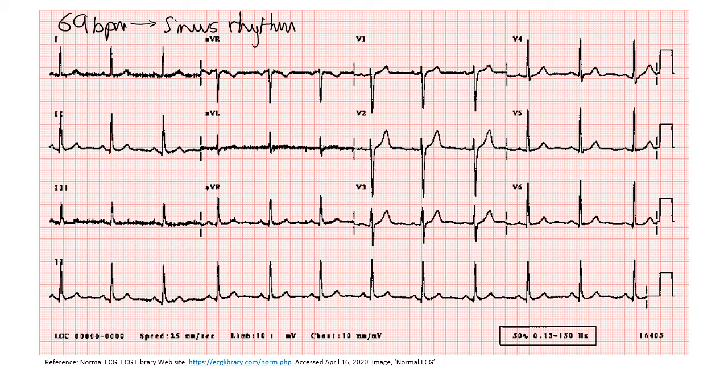The next thing that we'll be looking at is what each of the different leads on an ECG represent. So firstly, we've already looked at lead 2, which is a representation of the action basically of the heart. So if we quickly draw the heart here, once again, it's basically measuring the electrical conduction signals as they move from the top right to the bottom left.